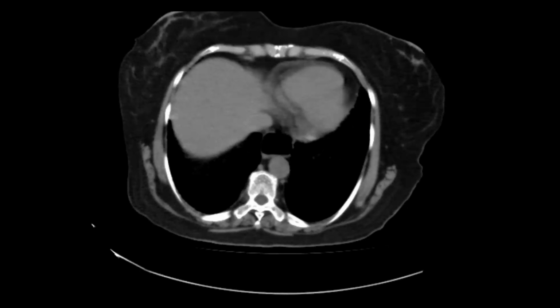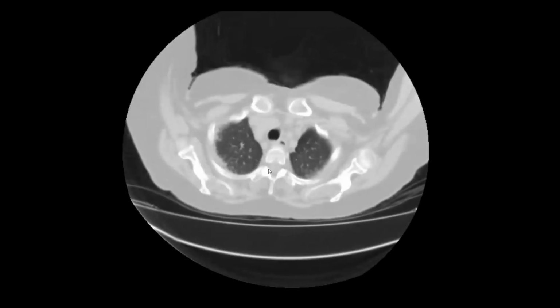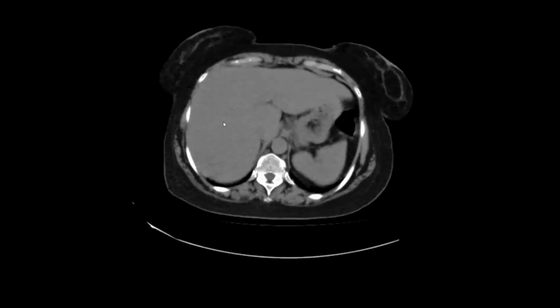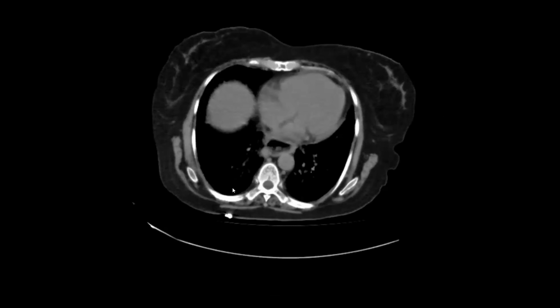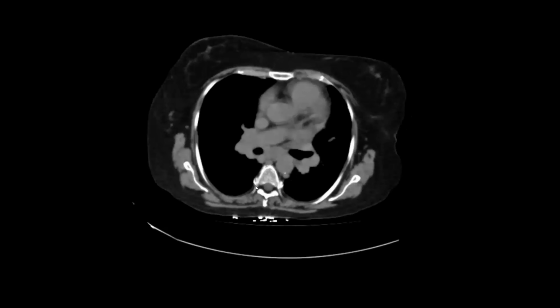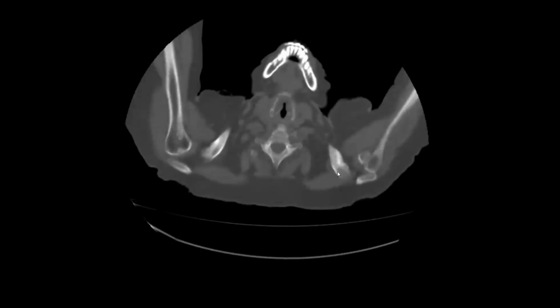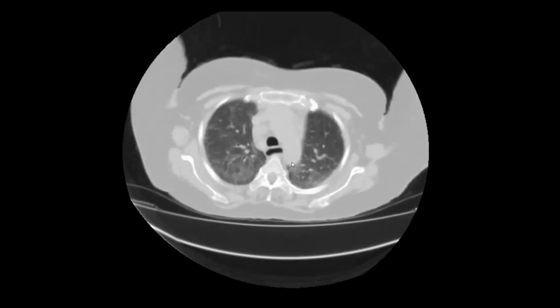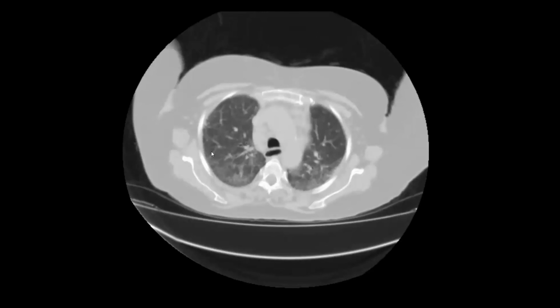And again, whenever you see a pattern of interstitial lung disease, there are four review areas. Esophagus, pericardium, then liver to look for any change in the density, to look for any amiodarone related issue. Then you have to comment upon the pleura for any calcification to rule out what? Asbestosis. And also the lateral end of the clavicles. Why do you have to see the lateral end of the clavicles? Scleroderma can cause erosion of the lateral ends of the clavicles.